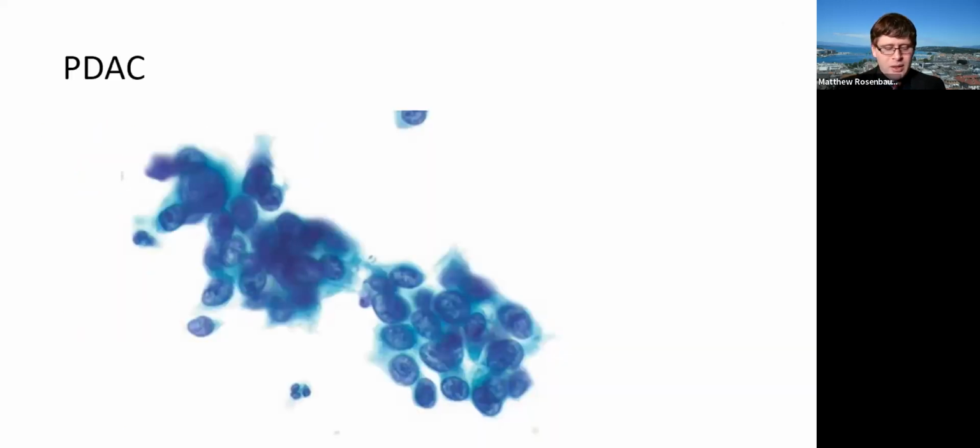So talking about the cytologic findings, it depends a lot on the histology of the pancreatic ductal adenocarcinoma. I'll talk a little bit later about how there is a wide range of histologies in PDAC. Generally speaking, though, traditionally they are relatively poorly or moderately differentiated carcinoma. So you'll see our standard highly atypical cells here. Here we basically have cells that are very jumbled up. They have very high NC ratio, abnormal dark clumpy chromatin, abnormal irregular nuclear membranes. You could argue that you're probably getting close to the 4:1 cross-sectional area, especially on the lower area.